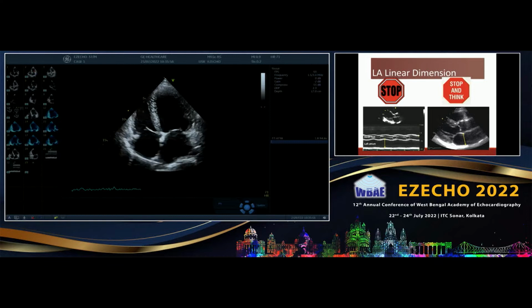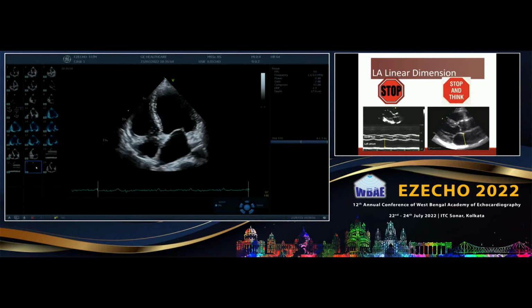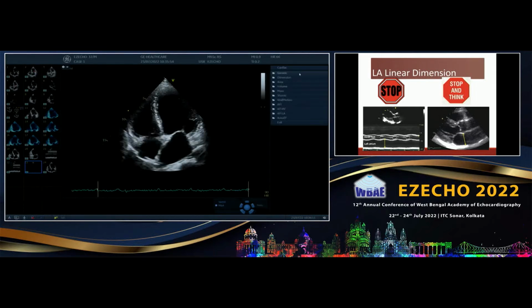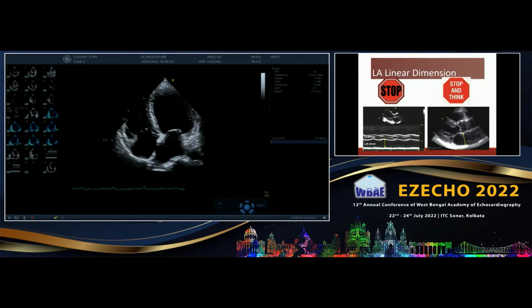So this is supposed to be the first step, especially in female diabetic cardiomyopathy, and it is pathological. They are progressing towards HFpEF. So concentric remodeling is not a normal thing. No, the question is, it's not concentric. It may be that the patient is non-diabetic. Indians tend to have a smaller LV cavity size. Correct. The question is, what should we report it?